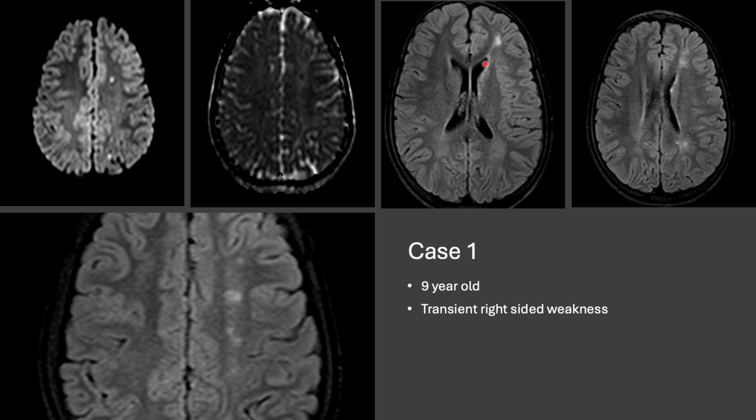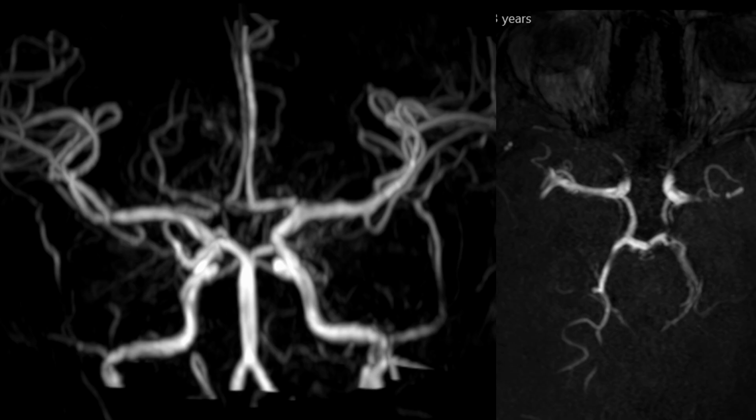Now, as you can see here, there are areas of chronic established ischemic damage within the left internal watershed regions, with a couple of foci that demonstrate acute diffusion restriction with corresponding low ADC values. And you can see this classic distribution of internal watershed. So this was a patient with HbSS variant sickle cell disease, which was giving rise to this picture.